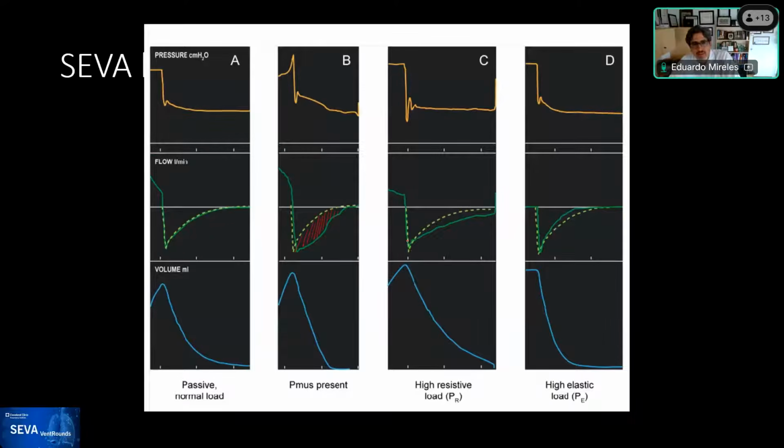And an important thing for us to recognize, and this sometimes causes challenges in our learners, is that they see these oscillations and these little changes on the waveforms. I would just highlight that as the gain improves or the sensitivity or the sensors get better, you will start detecting stuff from cardiac oscillations, muscle activity, or other items that will make some aberrancies on your waveform. But in general, you can see the exponential decay occurring throughout.